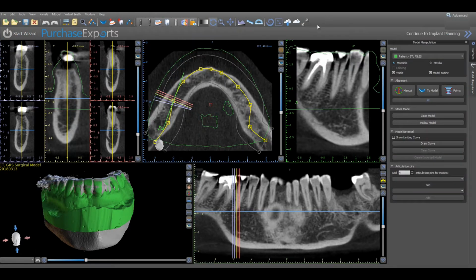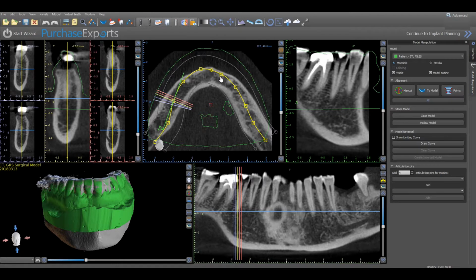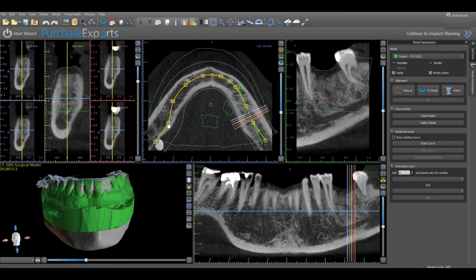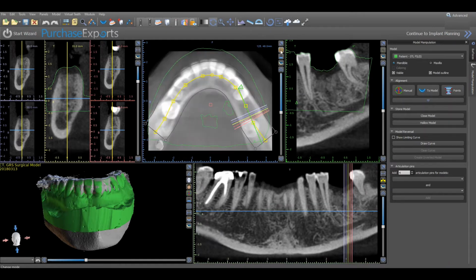Second, the curve of either the mandibular or maxillary arch must be established to create a clear visualization of the bone and teeth, which is critical when using implant planning software. Align the individual nodes to format a concentric arch in order to display a clear representation of the teeth and jaw anatomy. For better definition, the viewing mode can be toggled between CT scan slice or a radiographic composite in order to set the arch appropriately.